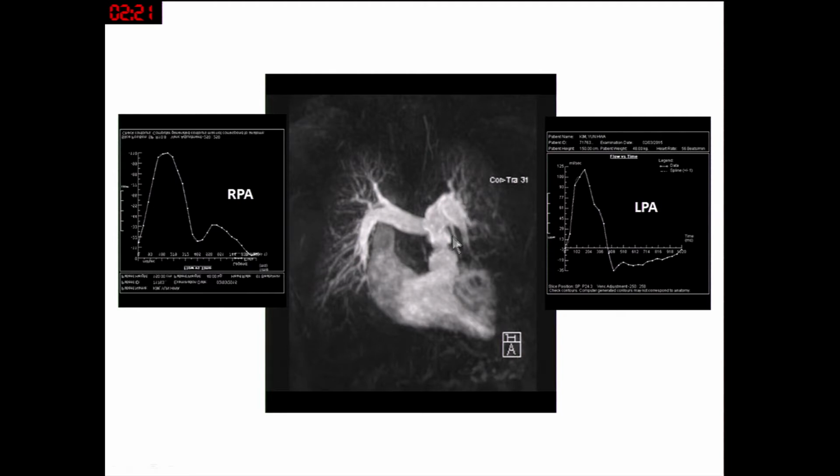When we carefully look at the MR angiography again, the right pulmonary artery looks quite normal, with a very reasonable size of proximal segment, and the branching and the peripheral pulmonary artery are quite nice. But on the left side, the central pulmonary artery is somewhat dilated and tortuous, and the segmental artery also looks very tortuous, and the diameter is not so big, it decreases abruptly, and the peripheral vasculature branching is quite poor. These findings are known as pulmonary arterial hypertension.